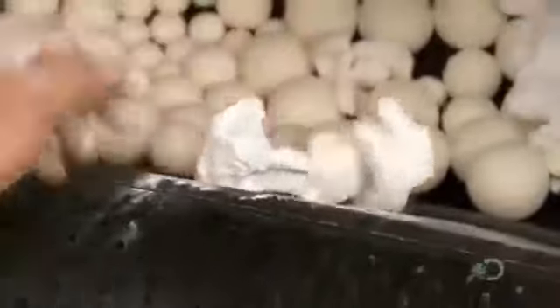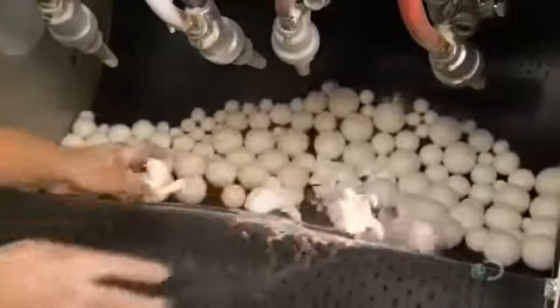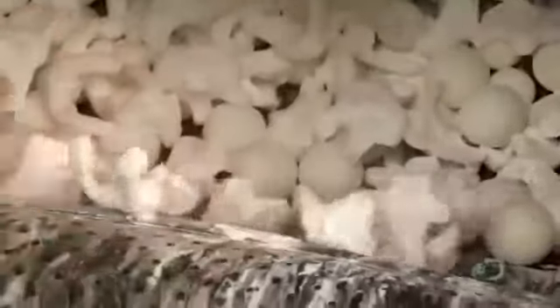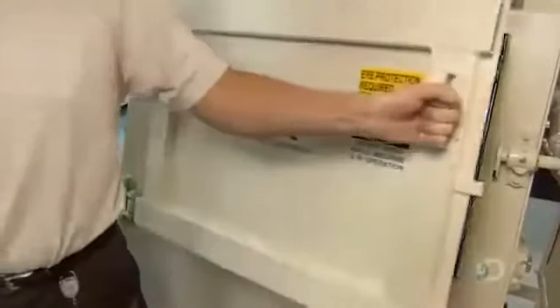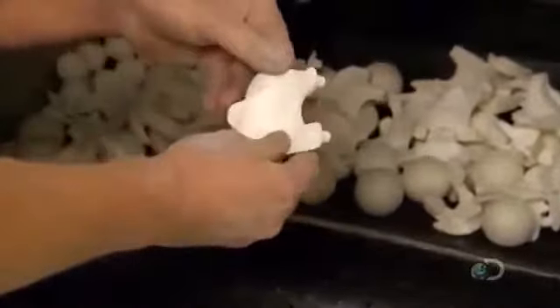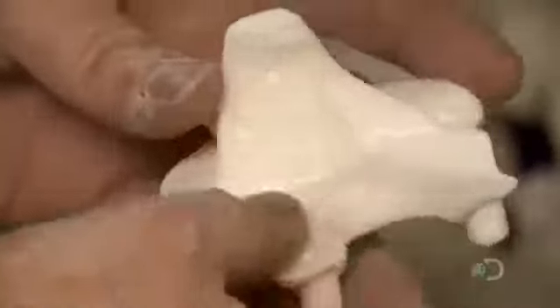Next, the templates go into a tumbler containing plastic balls and air jets. As the drum rotates for 20 minutes, the balls knock off and the air jets blow off most of the remaining powder. The templates exit the tumbler 90% clean. They go through 2 wash cycles to remove the last remnants of powder. Before packaging, they'll be sterilized.